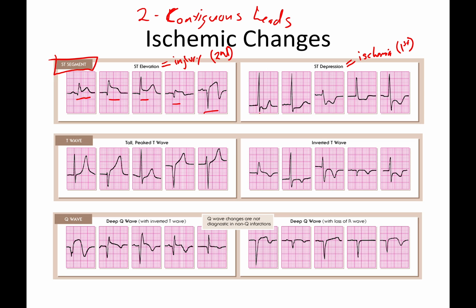And the same thing here, so these have the T wave itself up, that one's upright, flat, and then inverted.